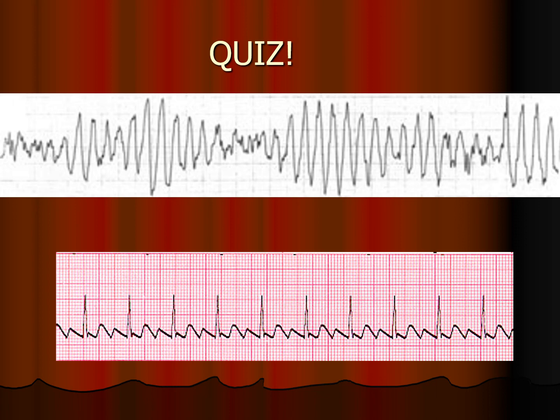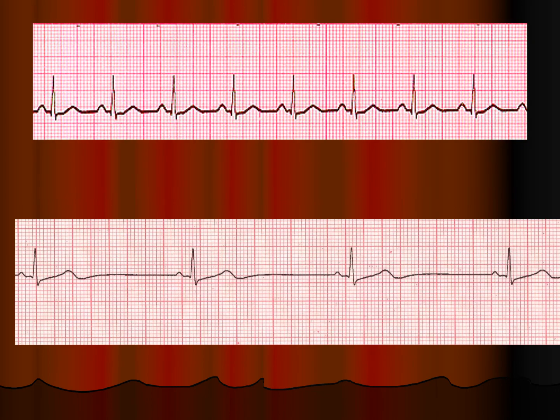I wouldn't put that on a test. But up here, let's look at our rate. Chances are this one, we have a pretty upright perky P wave, a nice skinny QRS, and a nice upright T wave. There's no ST segment problem going on. That's a sinus rhythm, normal sinus, right?